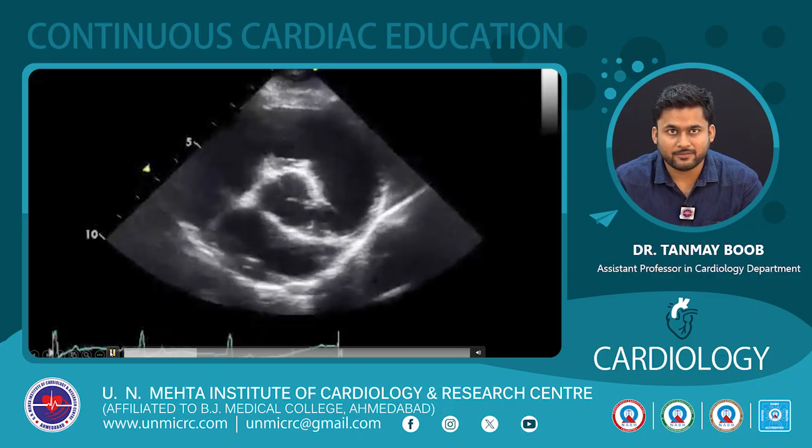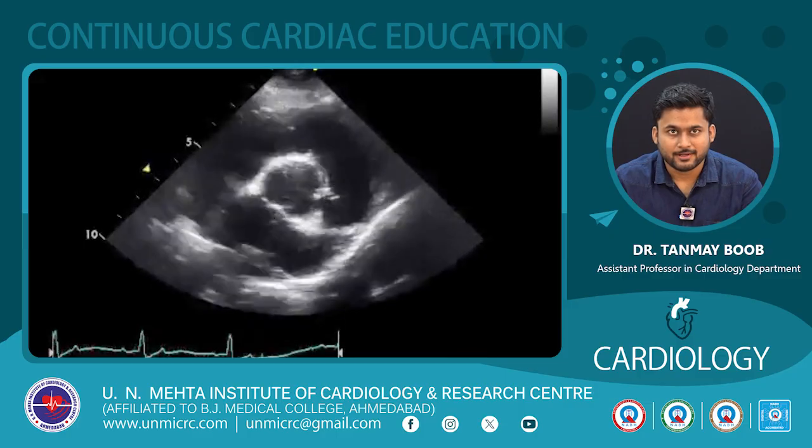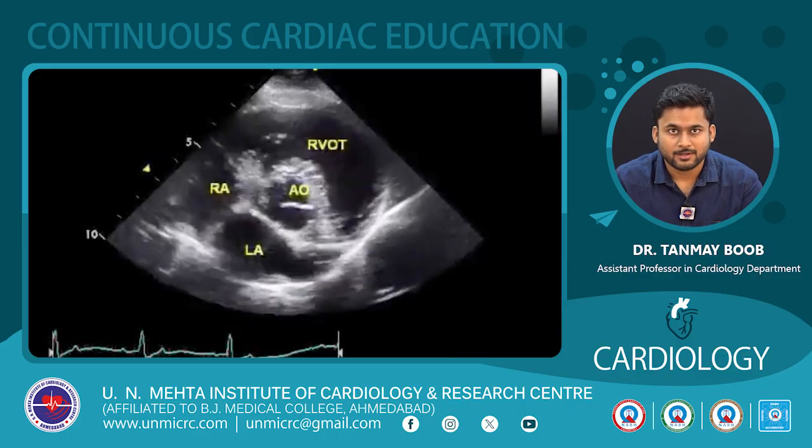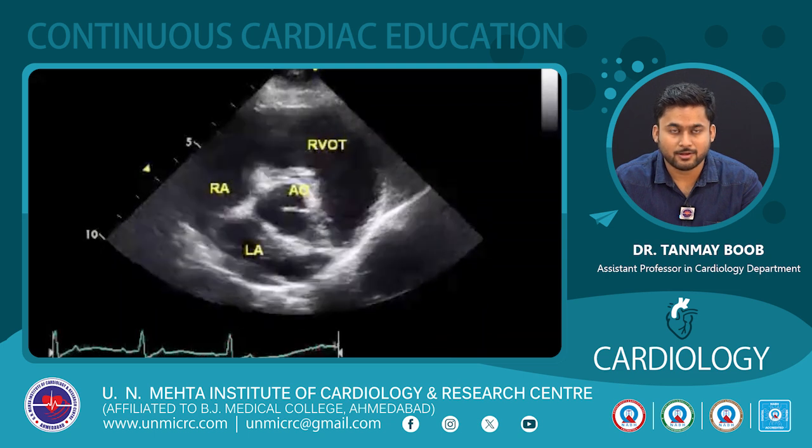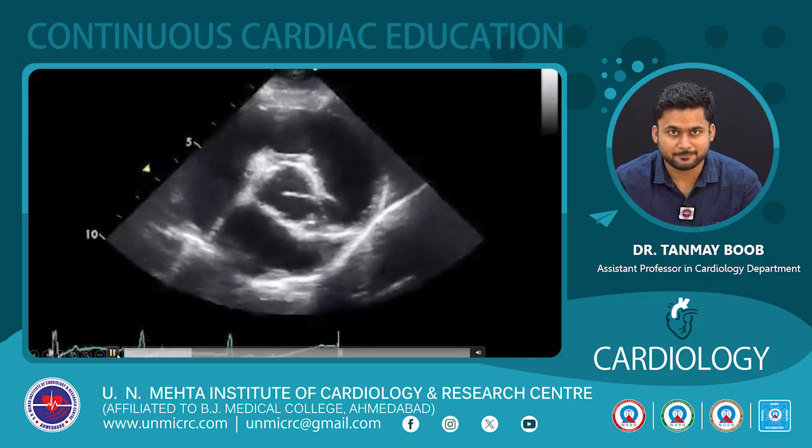This is the modified parasternal short axis view demonstrating the two tricuspid leaflets, that is the septal and anterior leaflets, along with RA, LA, RVOT and aorta as labeled in the diagram.